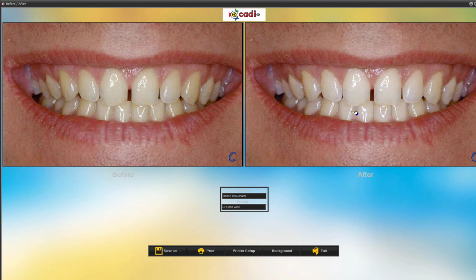If you do take a picture with a full face and zoom in and do this, it really has a much better impact when it comes to seeing the full face and how the whiter teeth really bring out the facial features, the eyes, etc.